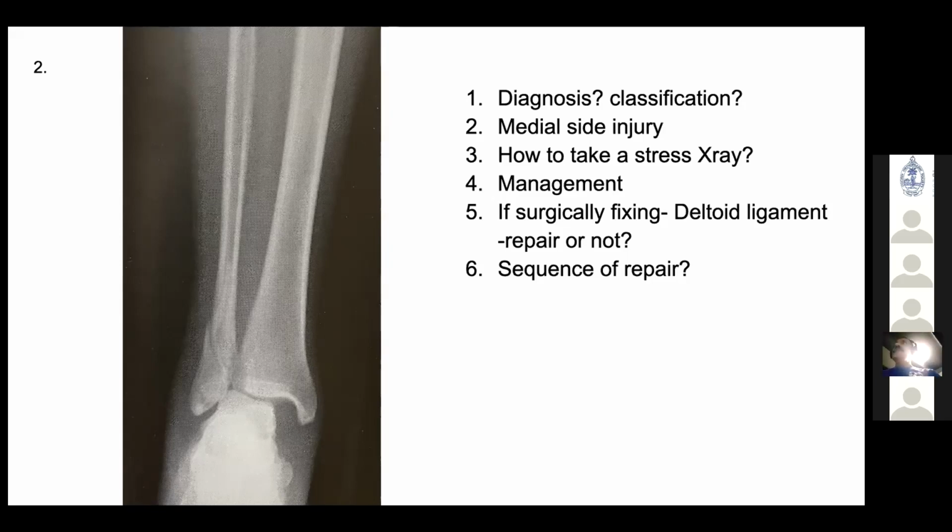And also, whenever you have an oblique injury of the fibula, if you trace the lateral view, the fracture starts from anterior to posterior or posterior to anterior, Srinivas? Sir, in supination, it starts anterior to posterior. Exactly. So if you look at these two things carefully, you can give an opinion whether it is pronation external rotation or supination external rotation.